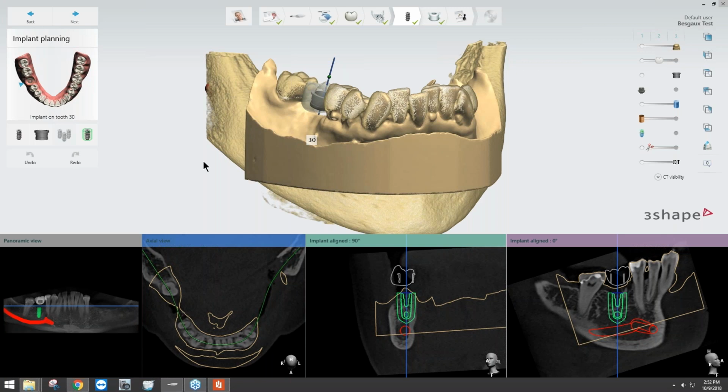For the surgical guides, it is required to have both the CT scan and the surface scan. There are ways in 3Shape to make other types of placement jigs, but it's technically not supported by the printer materials or the FDA to do any surgical guides without CT placement.